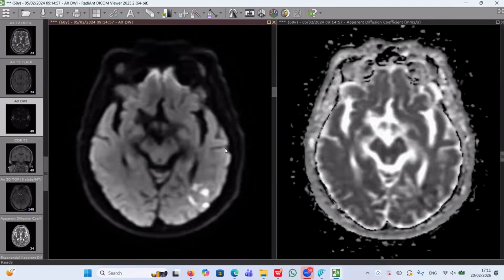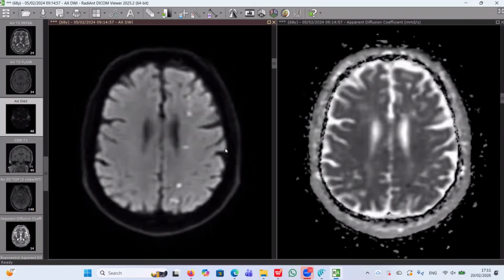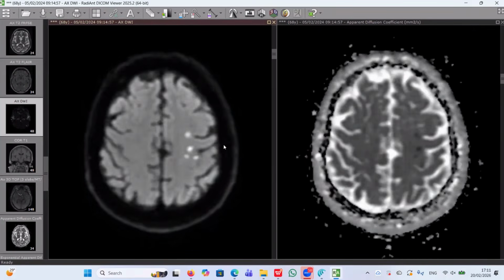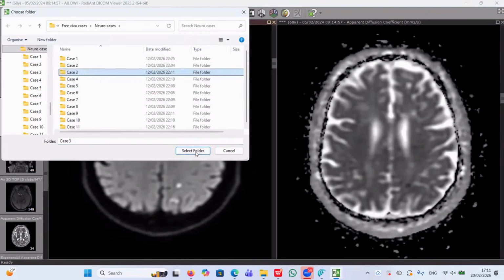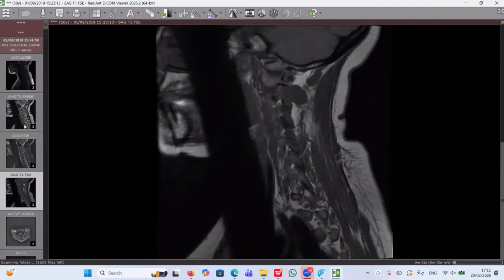Okay. Most likely watershed infarcts are developed secondary to hypoperfusion, not embolic disease. Embolic disease and hypoperfusion can cause external type watershed infarcts, but most likely the internal type is caused by hypoperfusion. Okay, can you keep with me? Can you see this case with me, please?